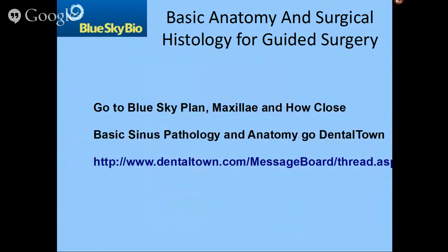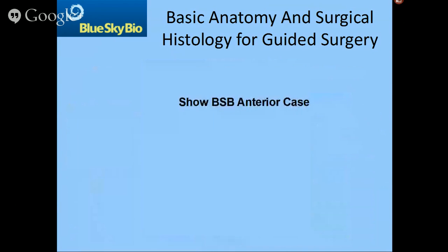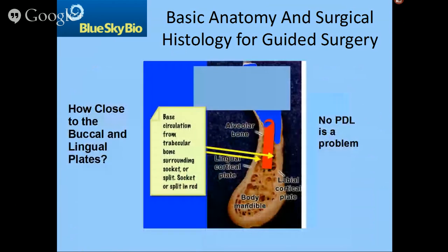So let's. What I want to do now is spend a little bit of time on a maxillary case, just so you can see it, and just so we can go ahead and identify the sinus.